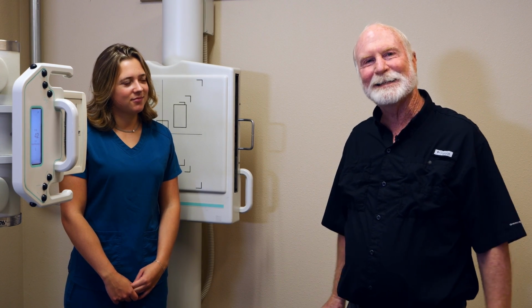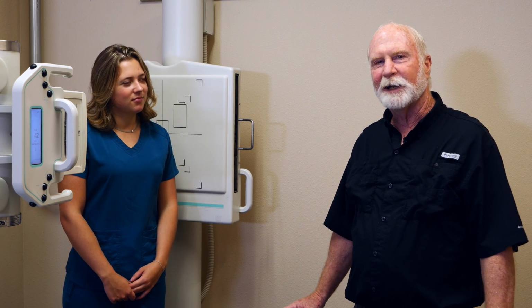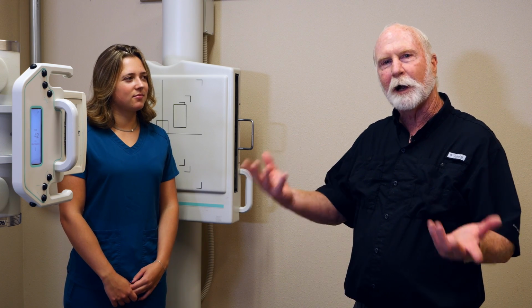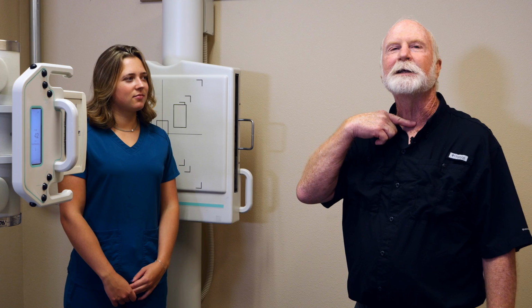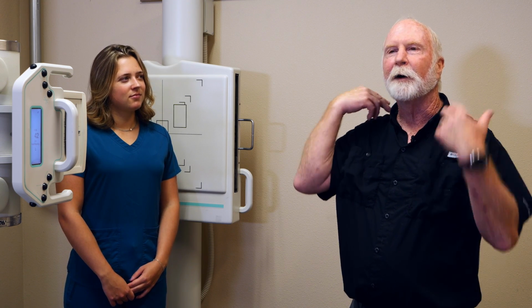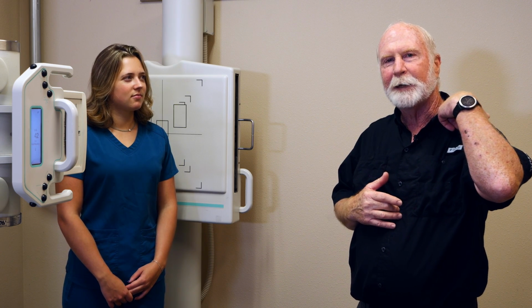Hey everybody, this is Brent. We're going to talk about T-spine today. T-spine is typically just an AP and lateral. There are rare cases we might take an oblique, but what I've experienced is most people, as a young radiographer, tend to cut off the top of the T-spine. Remember, the T-spine is a couple inches above the top of your sternum, above the level of your shoulders. You've got a lot of room down below. So we're going to talk about AP and lateral T-spine.